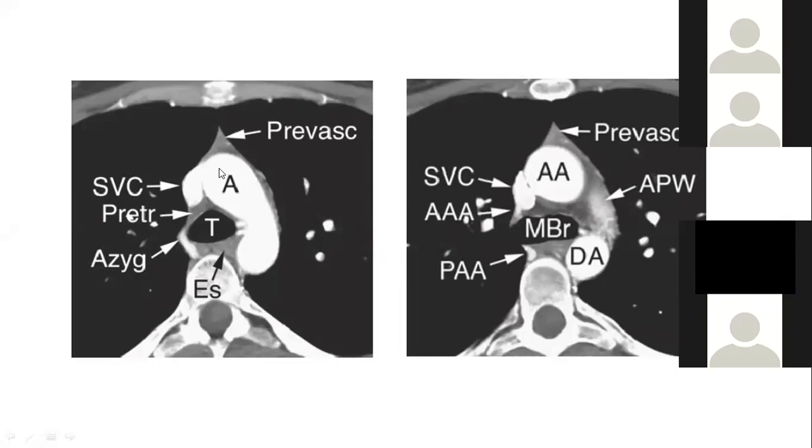So at this level, almost, we find the carina, right? That is what we have to remember, and we cannot falter in identifying these structures as radiologists. Even in exams, or when we have to comment on cases, we have to remember these structures.